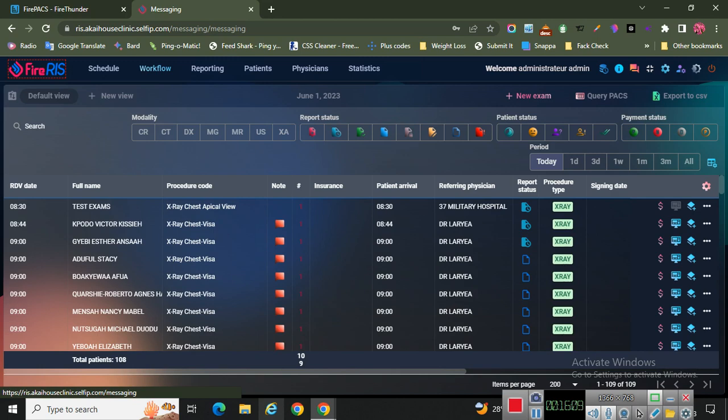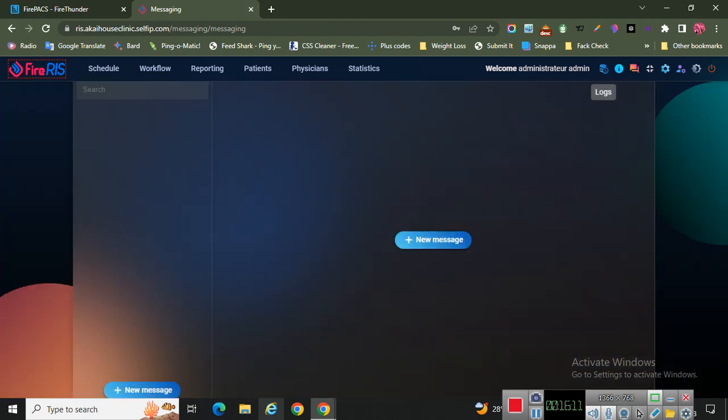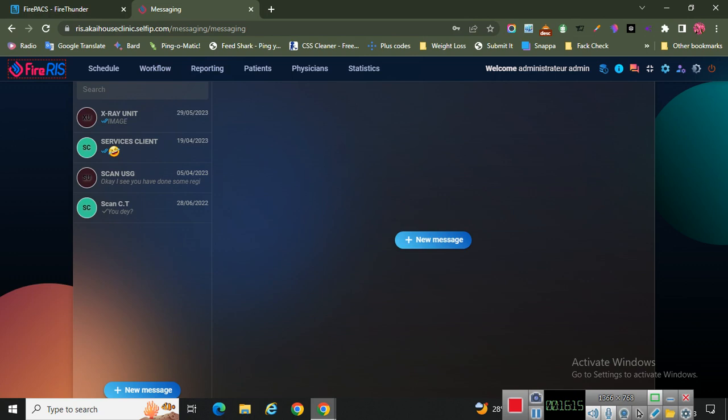Yes, there's this thing I have to tell you. Preferably, please use Chrome browser because sometimes the Microsoft browser hangs a bit, doesn't work. They said we should use Chrome, and this app doesn't work on tablets or phones.